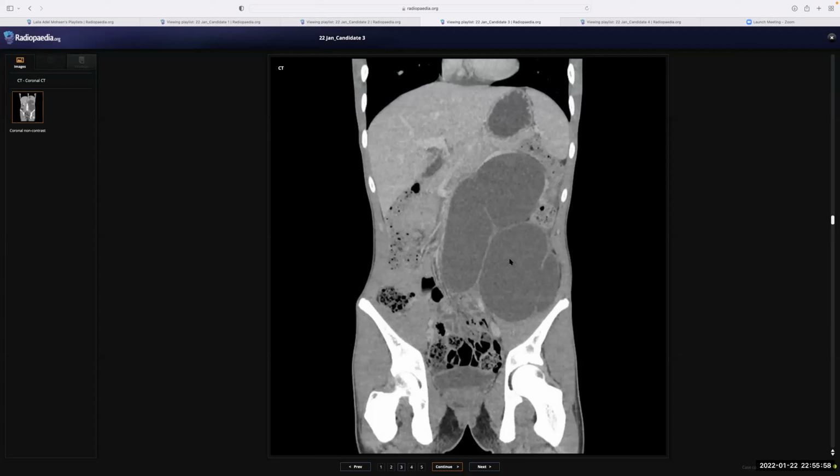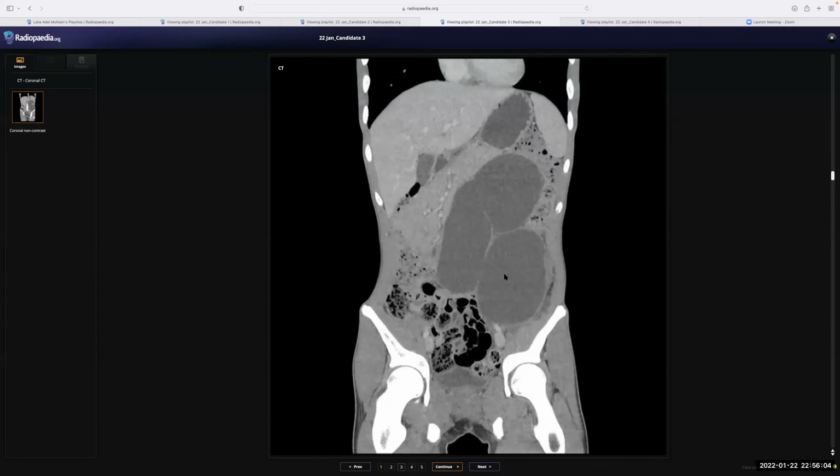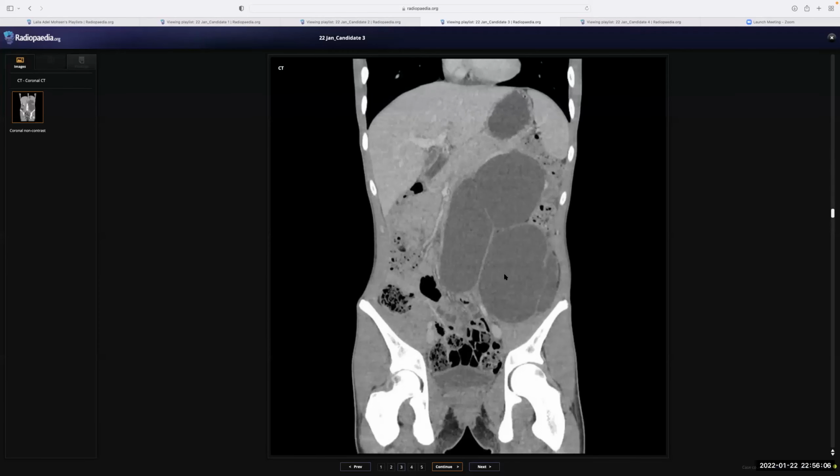And then you have three more differentials that you yourself mentioned. So look for the stones. There are no stones here. So you are left with two options: either this is a hydroureter due to other obstruction, vesicoureteric reflux, or megaureter. So take it stepwise. You need to exclude or rule out both possibilities. Which one will you do?